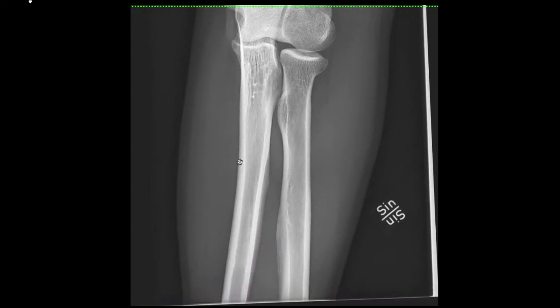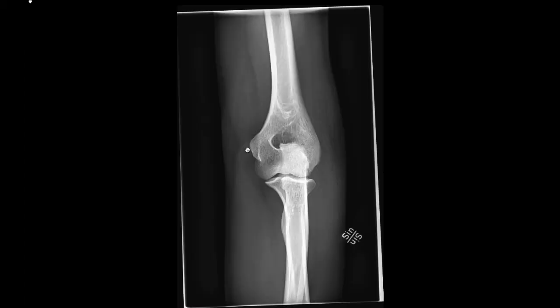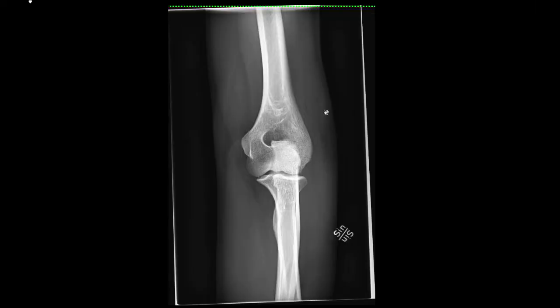It has to look smooth, and you use this on all your angles. Even here you try to look very carefully, because this is what separates a good radiologist from a bad one, is to find these subtle findings. Alright, so we have one patient here with normal anatomy.